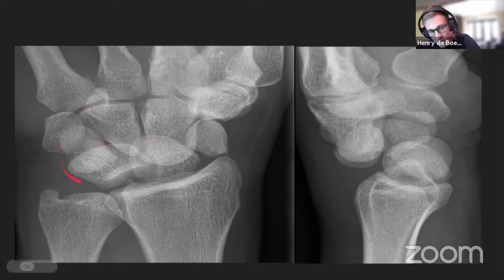So if you think of the previous ones we've seen, this is not normal. We should have this nice uniform line like we do here across the mid-carpal row, and it's not. It's all over the place, really. But I can't see a fracture. And these carpal bones, the shape of them also isn't right at all on the AP.